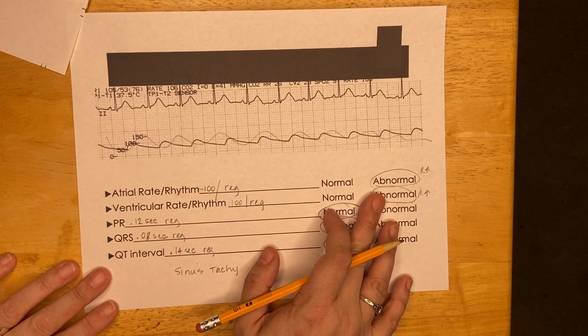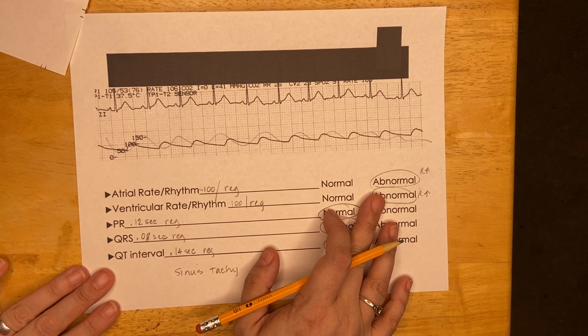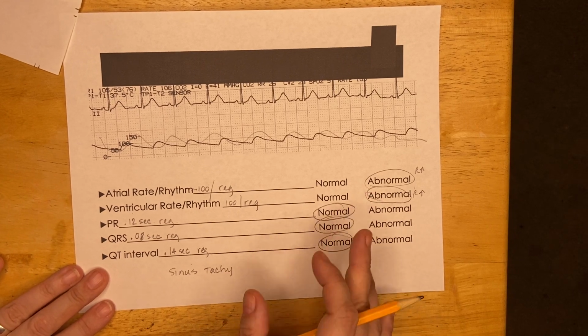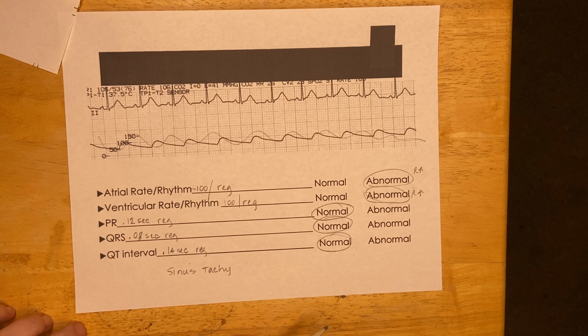You're going to see us do this over and over and over. But I hope that little bit of a tutorial will help you in your group's activity this week as you move to clean up all of our 50 strip measurements.